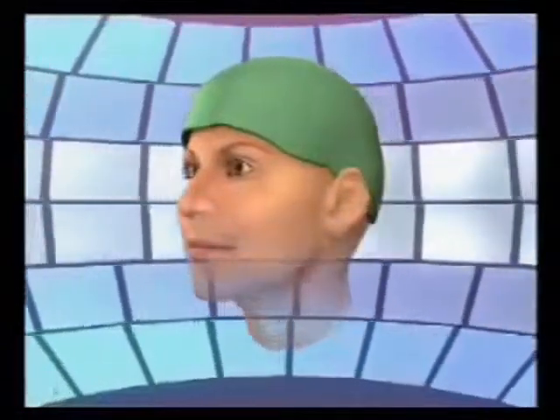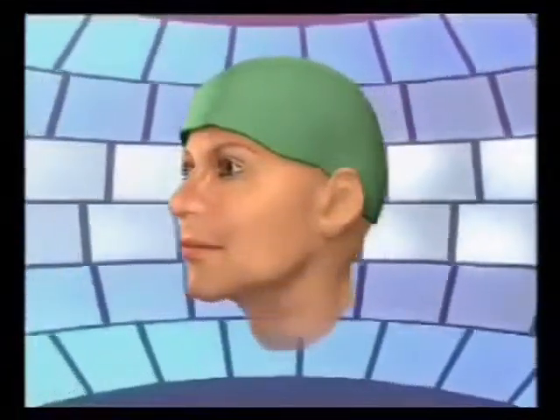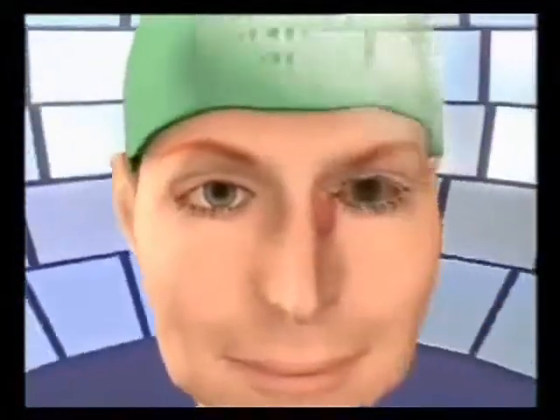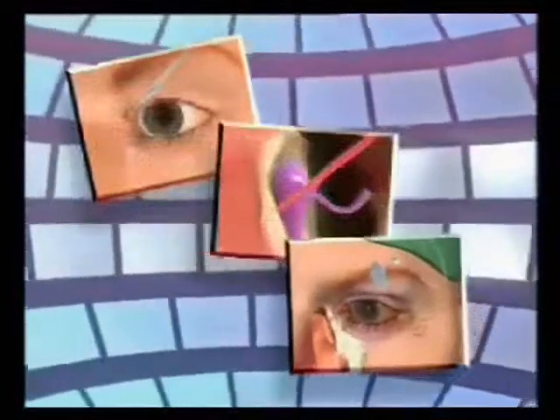Taking advantage of the most advanced data processing techniques, we present a virtual transcanalicular and endonasal diode laser-assisted dacryocystorhinostomy in order to provide a spatial view of the basic principles of this procedure on the excretory duct of the lacrimal gland. Opening the lacrimal sac, drainage to the nasal cavity, and restoration of normal tear function.